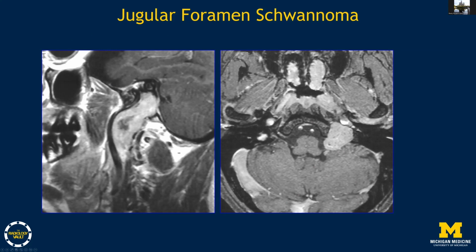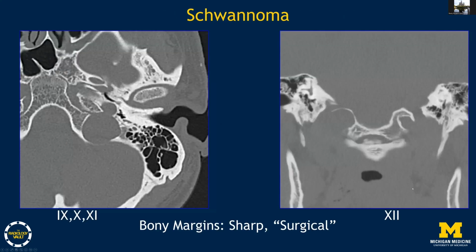That's the cyst. And note which way this thing is growing. It's growing up into the skull base and it's climbing medially towards the brainstem. So it's got an intramural cyst and it has a superior medial vector of spread. It is working its way medially towards the brainstem. It's kind of following the path of the nerve, and that's pretty characteristic for schwannomas.